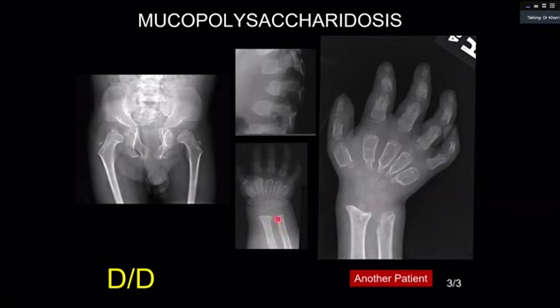You got it right that there might be subluxations here. There can be simian pelvis. With that, there will be fragmentation of the epiphysis. So please remember, it will also come in the differential diagnosis of stippled epiphysis. You remember we did a case in which both femora had stippled epiphysis. So it will come in that list also.